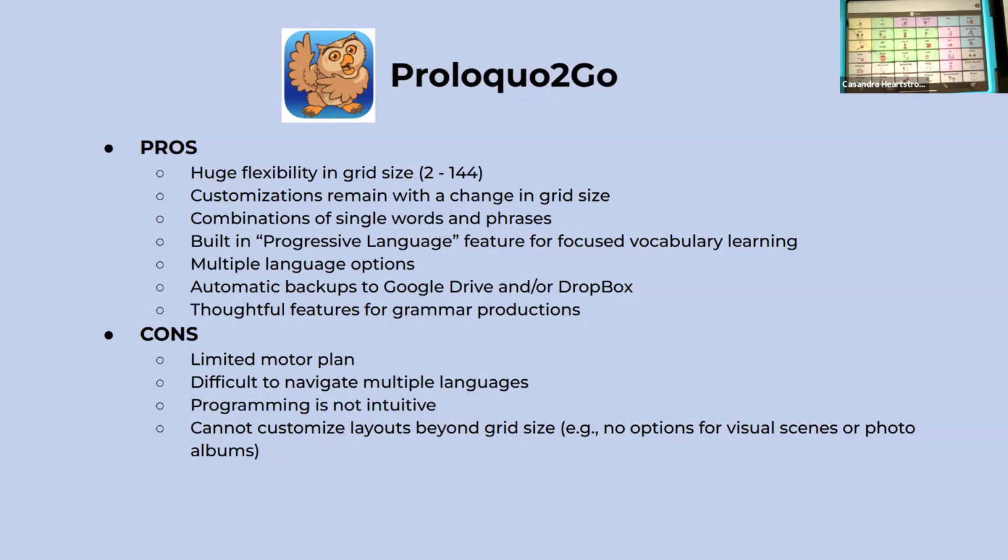Cons, it has a limited motor plan. Those words move around a lot. It's difficult to navigate to multiple languages. There's not an easy toggle button between English and Spanish pages. Programming is not intuitive when you go into editing, and you cannot customize layouts beyond the grid size.